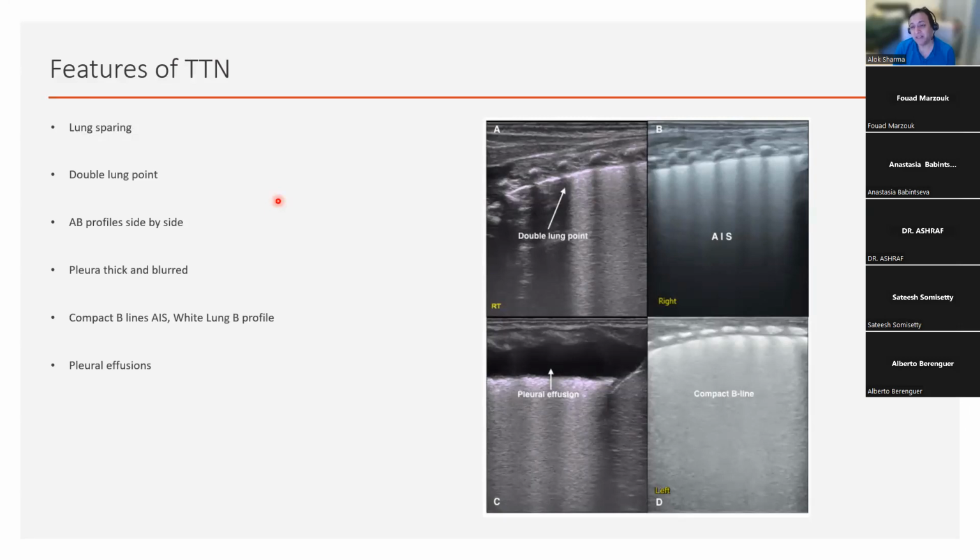And I would expect that you have done or imaged at least once all these 6 pathologies that I've just described. I do not expect you to necessarily have features of atelectasis. It can be tricky to interpret that, nor do I expect that at an L2, L3 level, which you achieve, that you can confidently differentiate the two, but we will cover it in a lot of detail. Any questions?